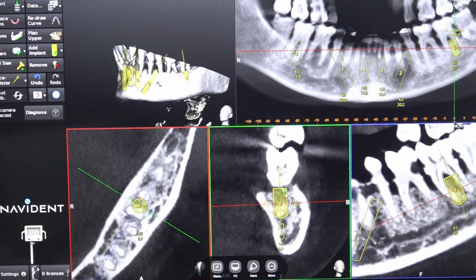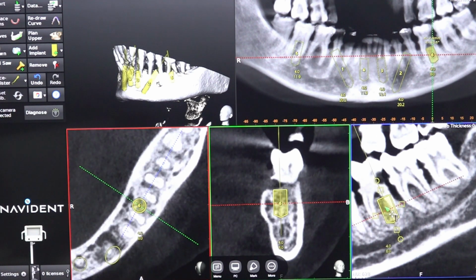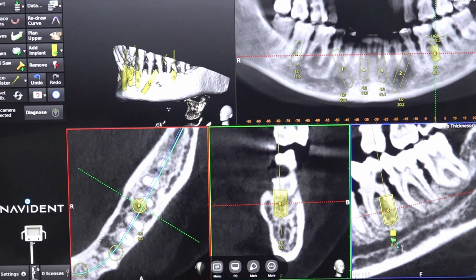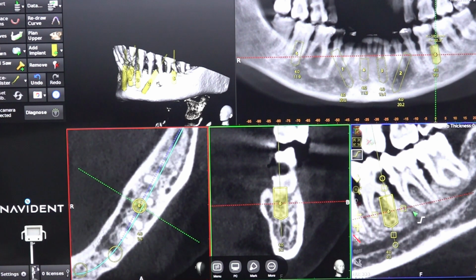It is not very favorable. Even if you place 8, it is close to the canal. So better to place the implant either in the interdental bone or in the distal socket, just the edge of the distal socket. Slight mesial tilt, an 8 mm implant will do fine.